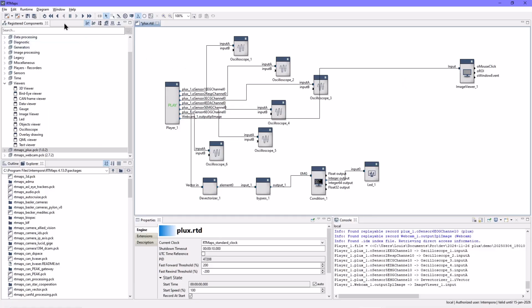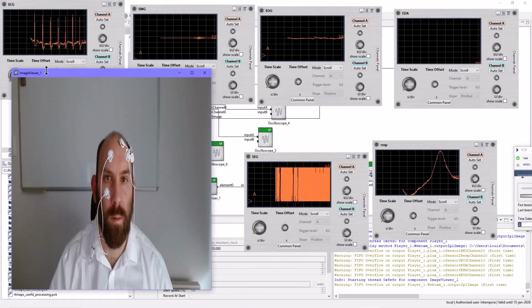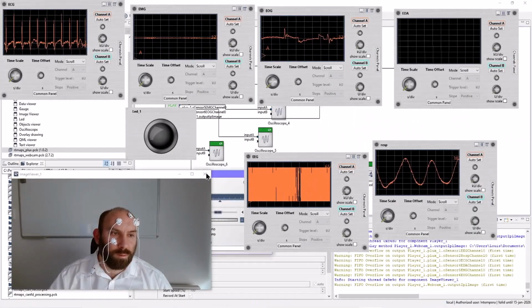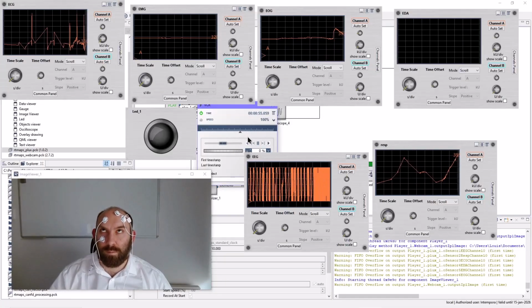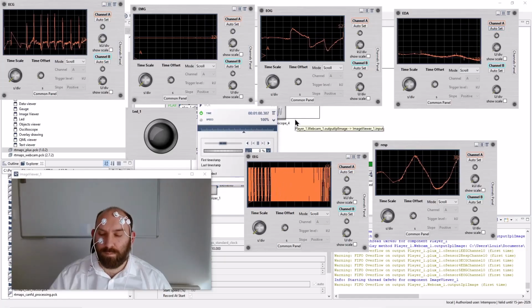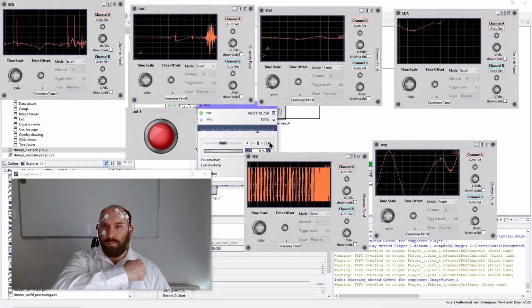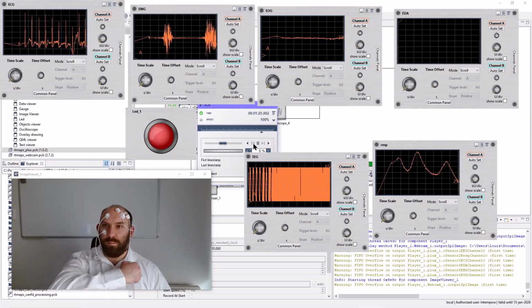We can now run the application. In the VCR, we can use the timeline to directly access a point in time. We can also pause the time or use the time wheel for finer time movements.